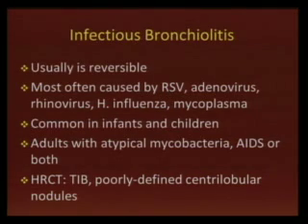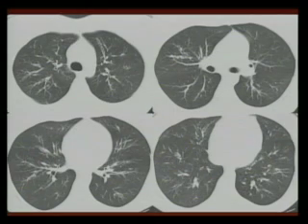What is the cause or the causes in cases of infants and children? Mainly respiratory syncytial virus, adenovirus, and Haemophilus influenzae. And on the CT and high-resolution CT, you can see the tree-in-bud pattern and centrilobular nodules.